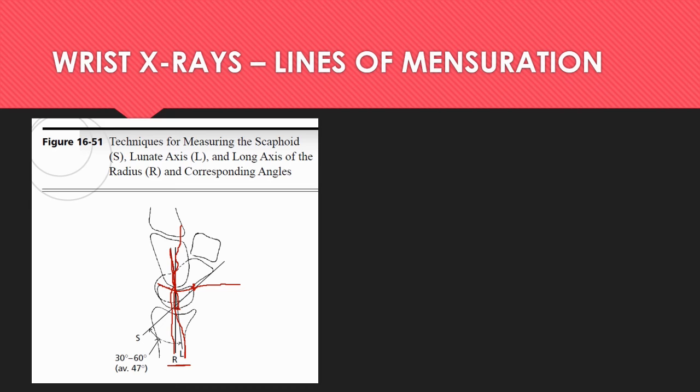The guides allow for a positive or negative 10-degree angle here. So also a normal angle would be if the lunate was extended over in this direction and the lunate angle went above that way. So this would be your 20 degrees of grace on the radiolunate angle.